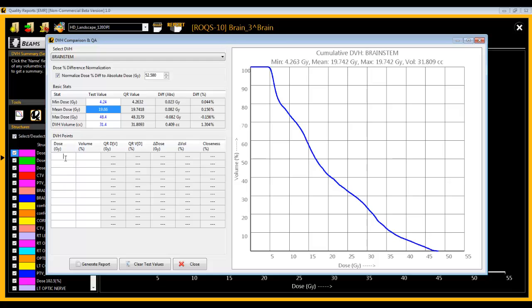But more than that, you can actually check points along the DVH. I've gone through here and I've extracted a few points from the Eclipse curves. One point I extracted was 10.01 gray, and the volume was 74.3. You can see here a black dot shows up to be exactly the point from the TPS curve, and you can see here it overlaps with the blue curve.